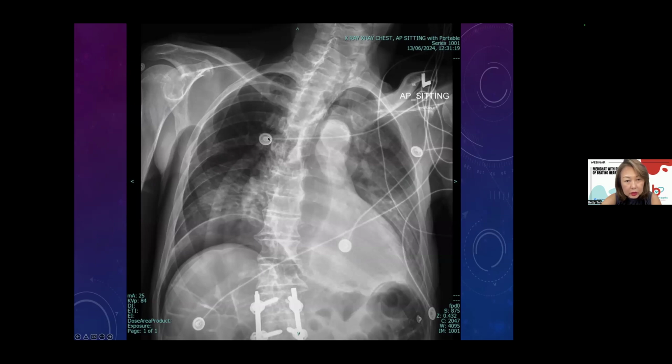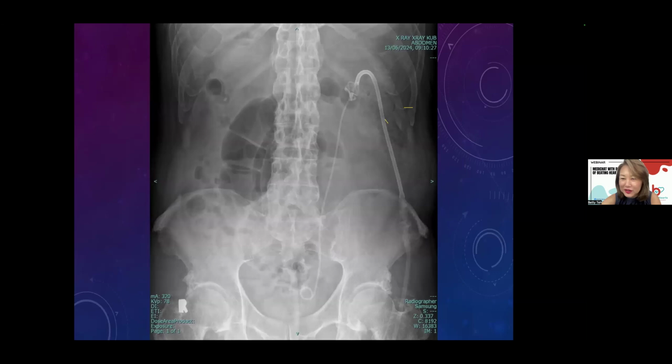Not the spine. The spine has degenerative changes. Under the diaphragm, yes, pneumoperitoneum. So again, I'll show you this is the gross pneumoperitoneum. Okay, no one should miss this again. All right, done. Next. Proud of you guys today.